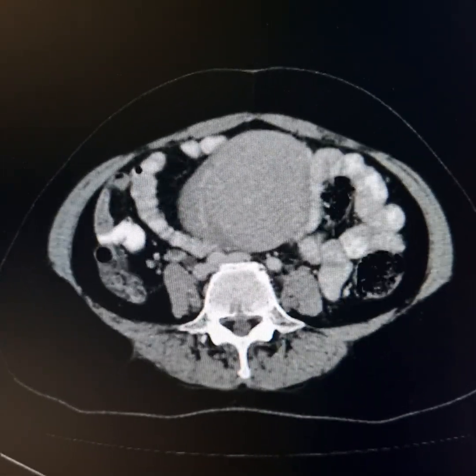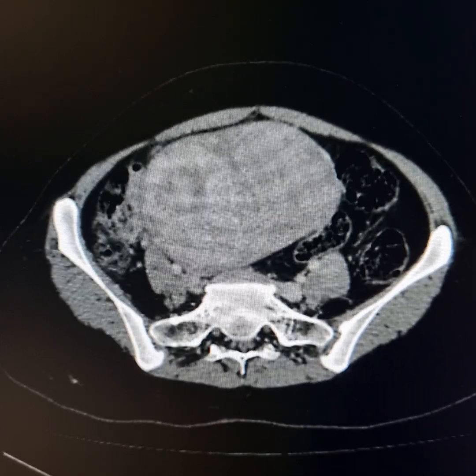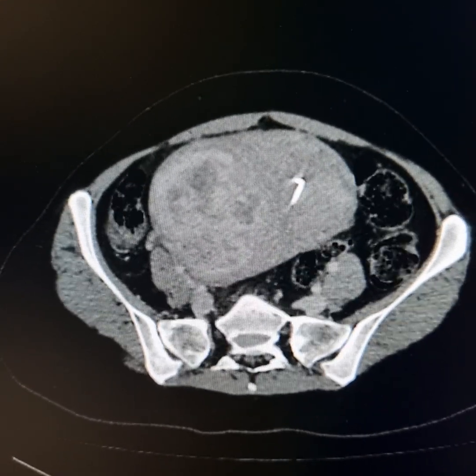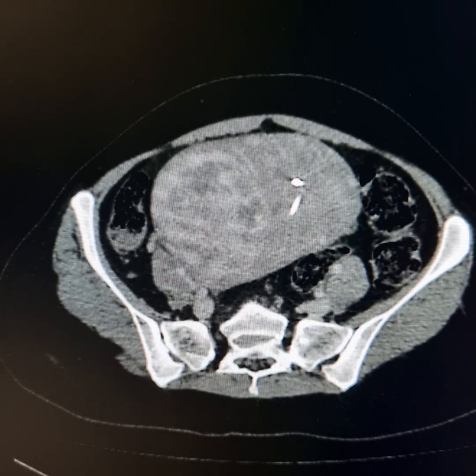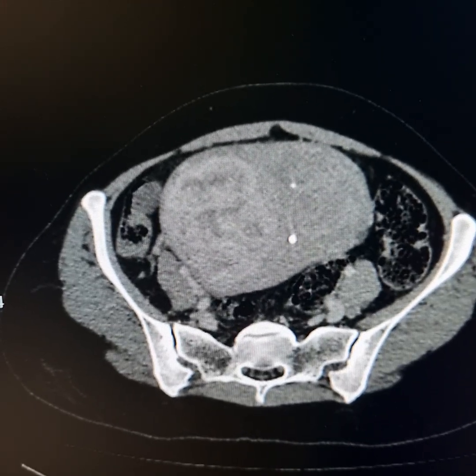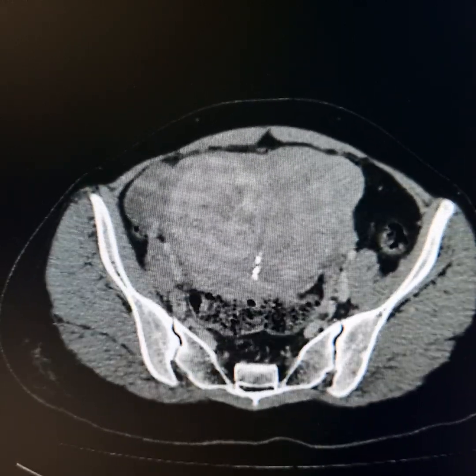The patient has multiple intramural uterine fibroids. These have resulted in marked distortion of the myometrium. Normal looking myometrium could not be visualized. There are two intrauterine contraceptive devices.